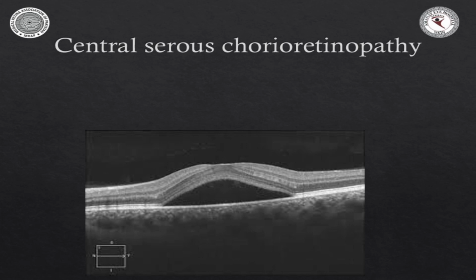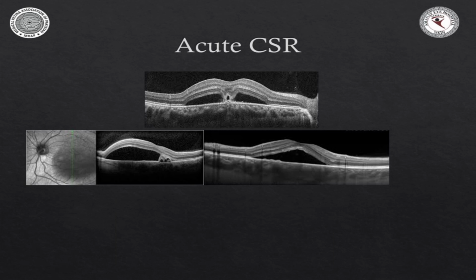Now, of central serous retinopathies, there is something known as the Batman sign. All of us were fans of Marvel or Disney or whatever. This is a Batman sign, and it's usually an indicator that the CSR is very, very acute.